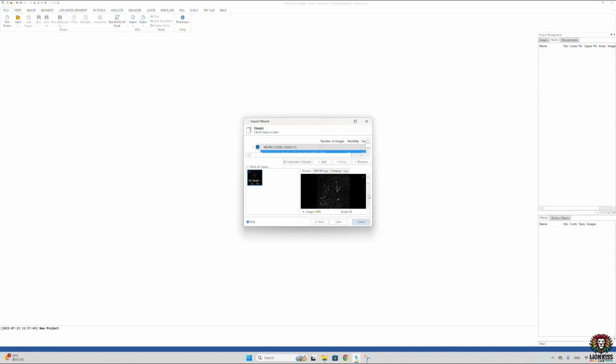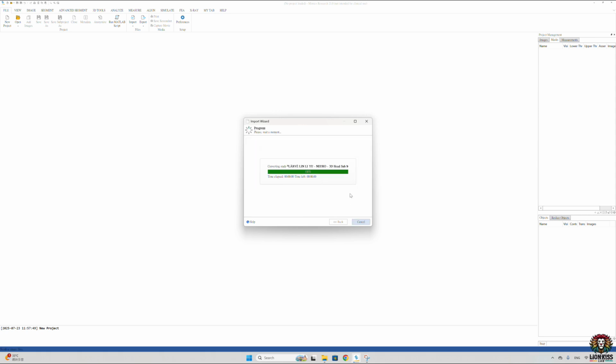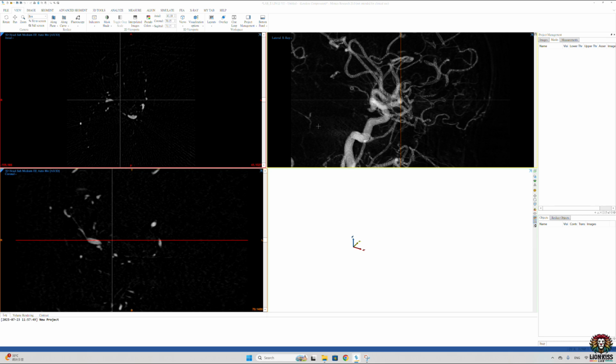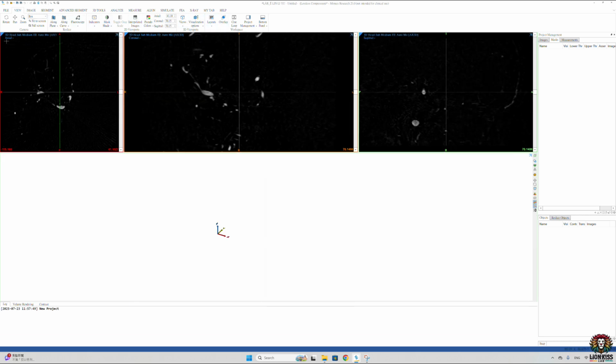So you can see that our image is okay. Then just open. So here is the Mimics open. I need to show different views. Go to the views layout and select the different ones. So this one is X-rays and another one is axial and coronal. From here I will use another layout, vertical, so you can see axial, coronal and sagittal views.